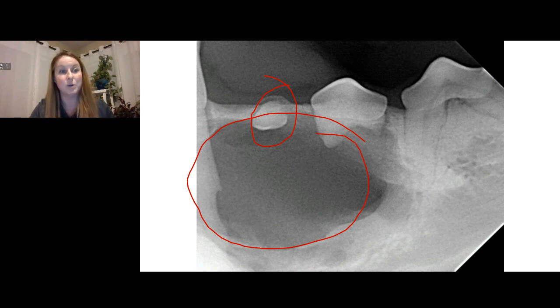So just making sure that that is why we are counting teeth, right? We want to make sure that we don't end up with cysts. And they don't only happen with first mandibular premolar teeth in dogs. Cysts can happen with unerupted teeth. Dentigerous cysts have to have unerupted teeth.